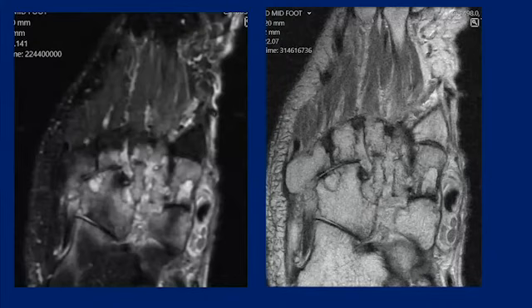These are coronal midfoot images in a patient with rheumatoid arthritis. We can see there's multifocal bone marrow edema pattern, cortical bone loss. Again, we're eating away the second intercuneiform joint margins, as well as the lateral cuneiform cuboid articulation. And then interestingly, we can see in the adjacent tibialis anterior tendon sheath, there are the so-called rice bodies, areas of inflammatory debris in the tendon sheath. Next.